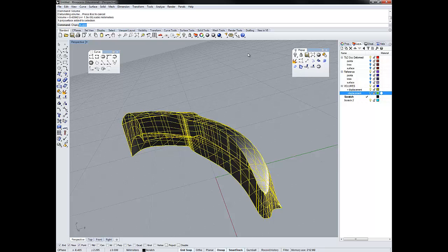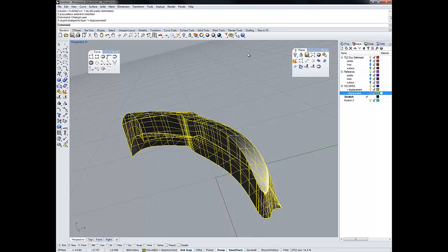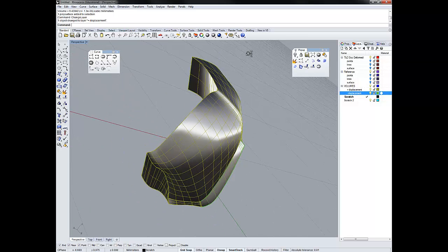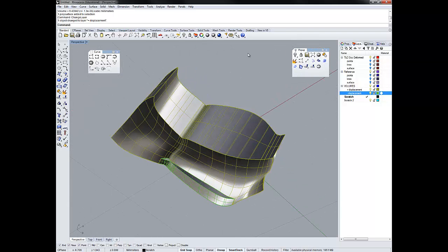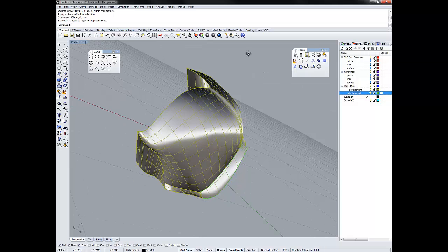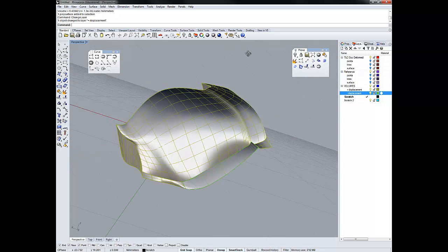At this point, we're going to change layers to positive displacement, and then we're going to turn on negative displacement. And what you're visualizing right now is the final product of this tutorial, which is the reference and deformed state of the canine diaphragm after a maneuver called TLC occluded deformed, and the negative volume displacement and the positive volume displacement.